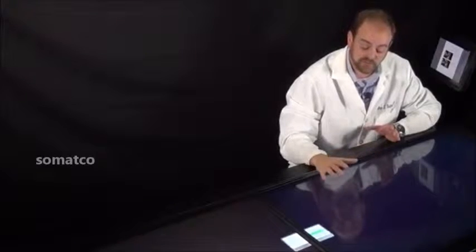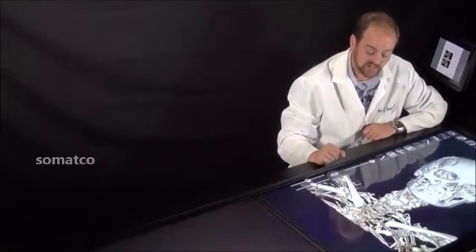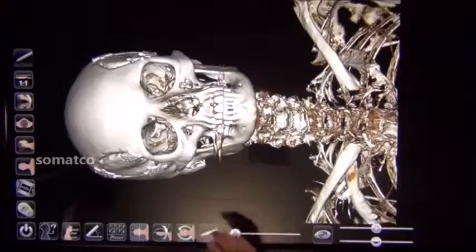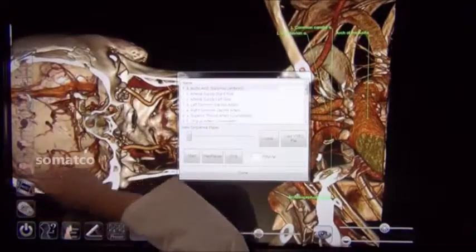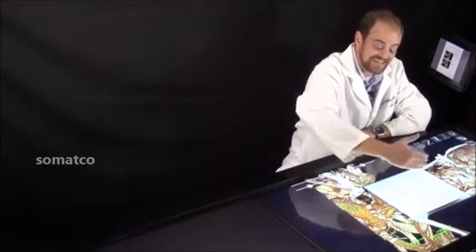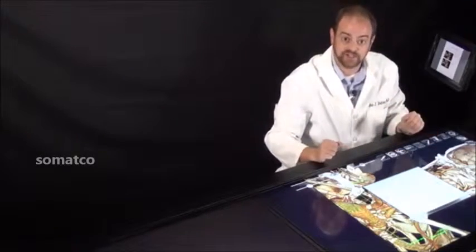When the case opens, it will load with the default orientation and render setting. It is not necessary with the curriculum project to modify any of the controls at this time. Simply select the film strip on the left-hand side of icons. The film strip icon will load what is known as the view sequencer. The view sequencer will contain a list of views meant to facilitate instruction within that region.